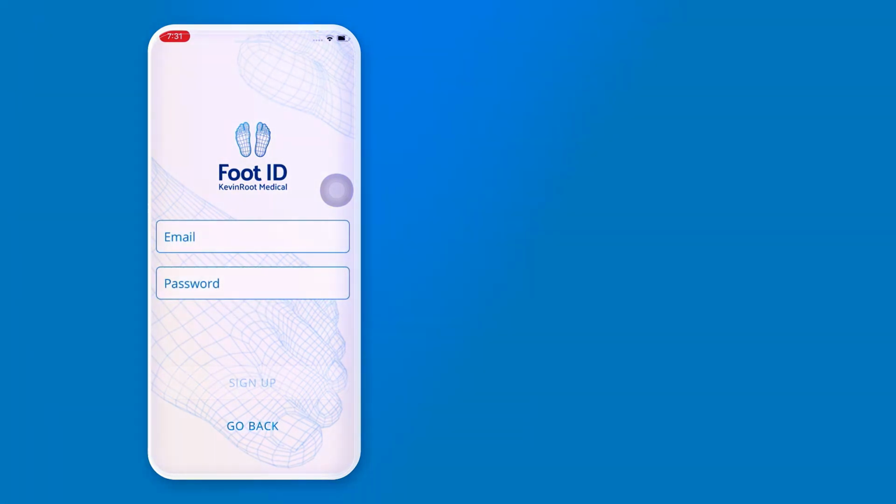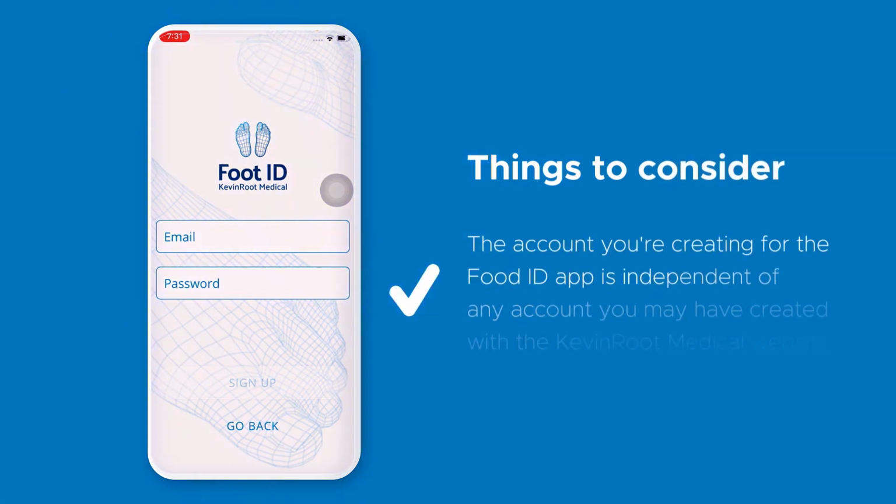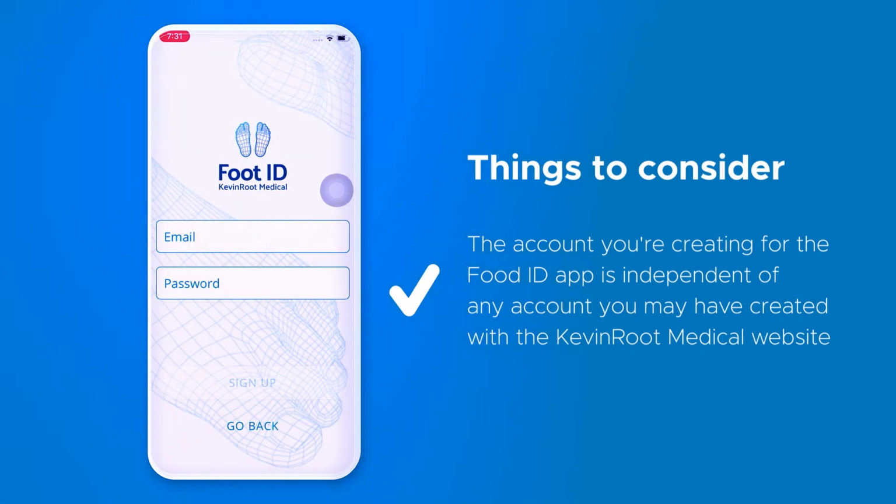At this point, there are a couple of things to consider before we proceed. The first being, the account you are creating for the Foot ID app is independent of any account you may have created with the Kevin Root Medical website.